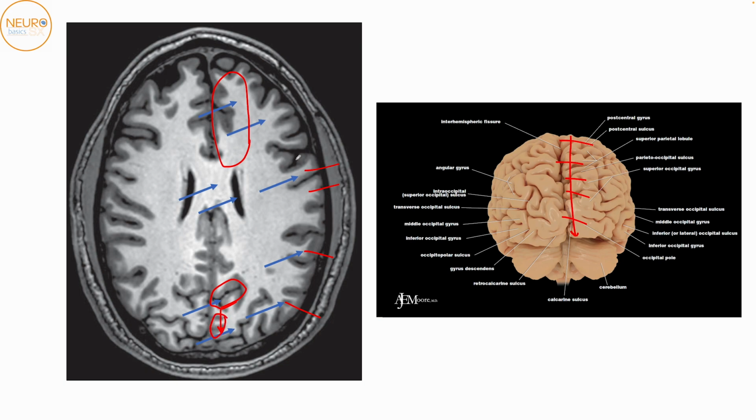This is the cuneus. At this cut, we're now starting to see the lateral ventricle. So this is the body of the lateral ventricle. And the structure running between both the bodies of the lateral ventricle is the body of the corpus callosum.